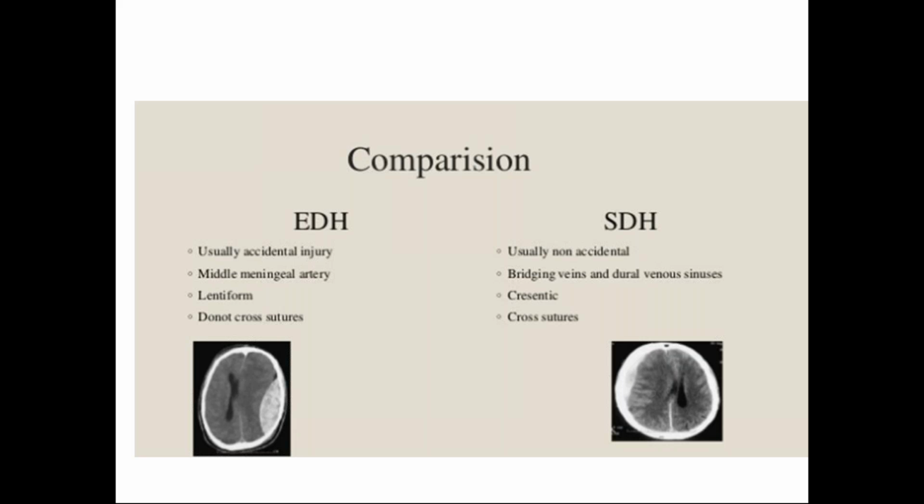And since the dura is present medial to the hemorrhage, it forms a lentiform shape, that is a lens shaped structure, and it does not cross the suture lines.